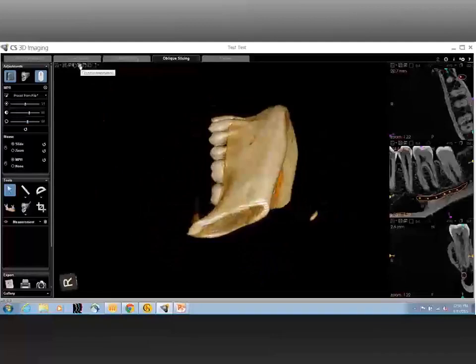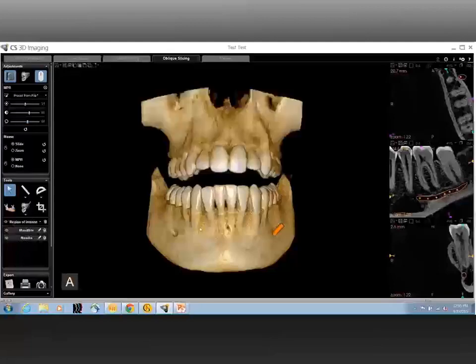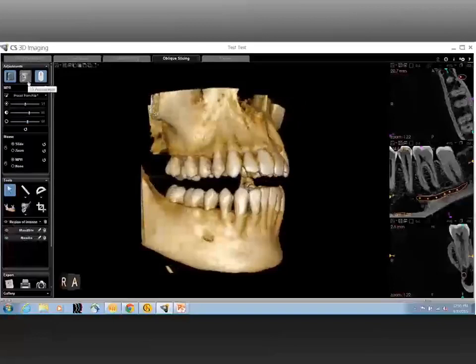And on a more serious note, carotid atheromas: in a slightly larger field of view where you can capture up to the angle of the mandible and the ascending ramus, you would possibly be able to see even carotid atheromas if they are present. It should also be noted that carotid atheromas may be visualized even on a two-dimensional panoramic, and not just on a three-dimensional scan.